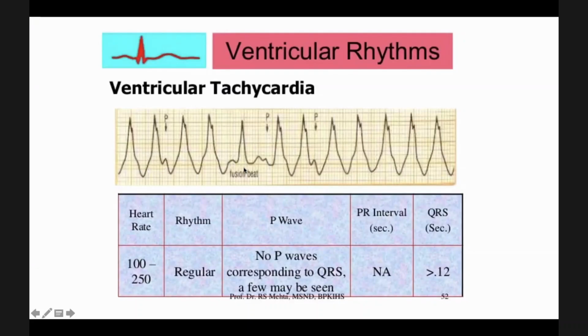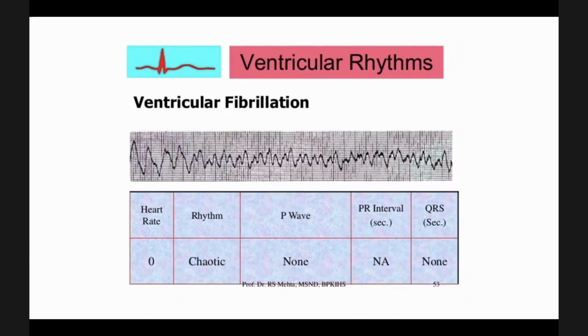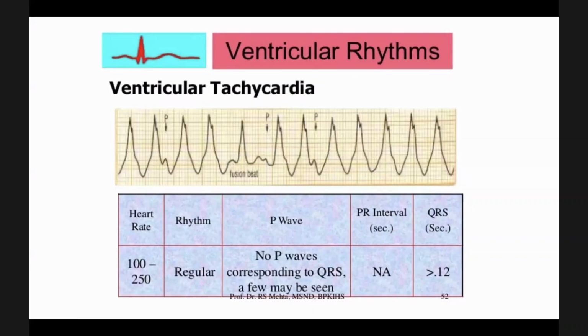We'll see whether I have included another ECG for ventricular tachycardia. Not like so. So ventricular fibrillation. How do you manage the patient with ventricular tachycardia? So there's a broad complex regular tachycardia. If you see a broad complex tachycardia, what are the causes usually?